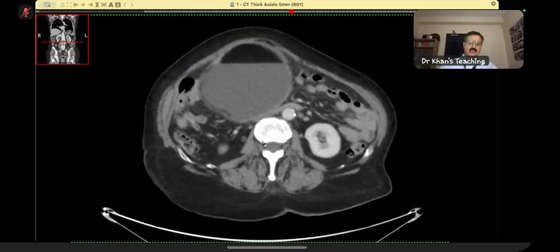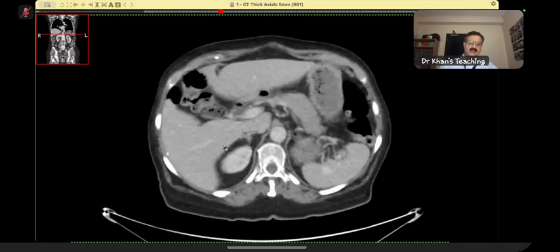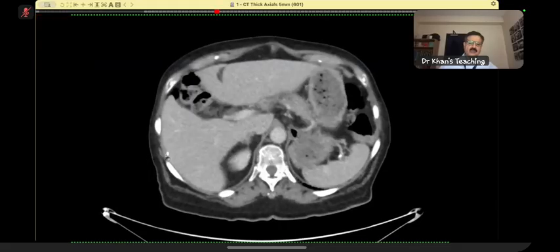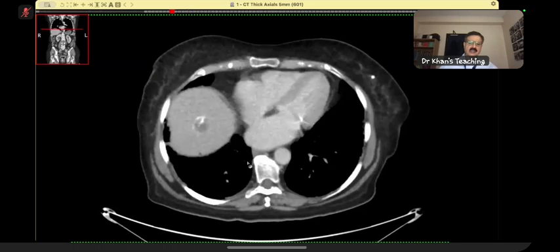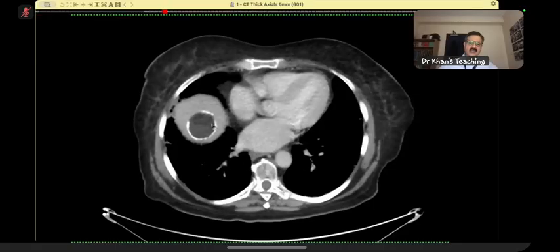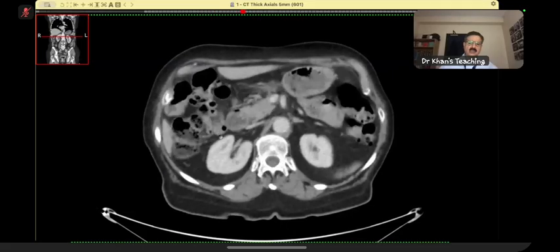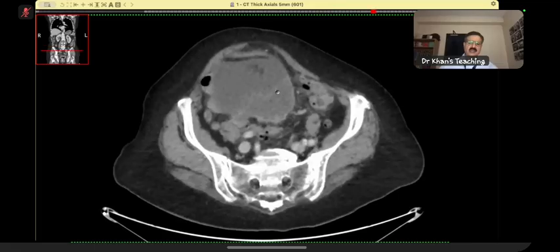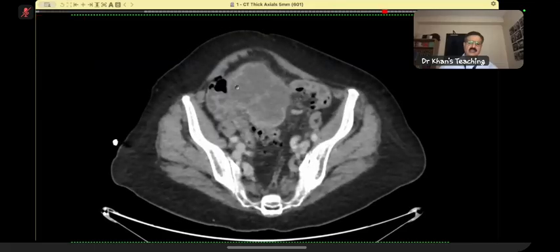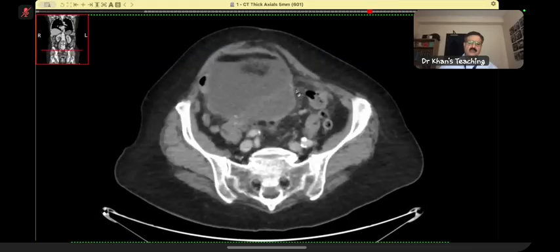If we go towards the liver, we can see some calcification sitting on the serosal surface, maybe part of the same thing. And here, this is that metastasis which we had looked at on the opposed phase T1 weighted sequence. As far as the main lesion is concerned, this is all fatty. As we go there, this is that ugly looking, enhancing nodular malignant type of mass.